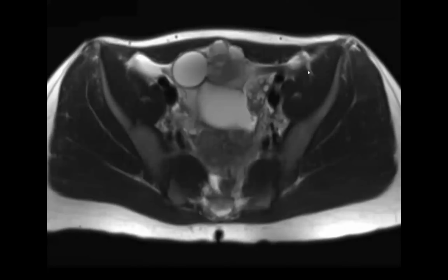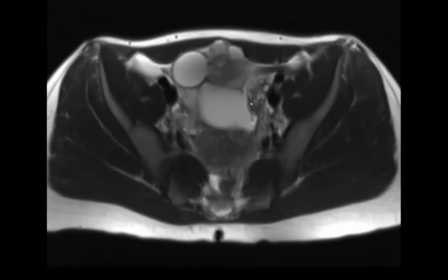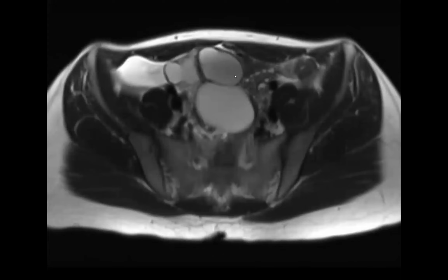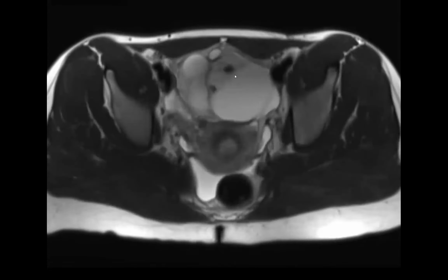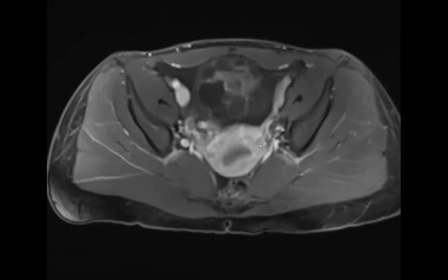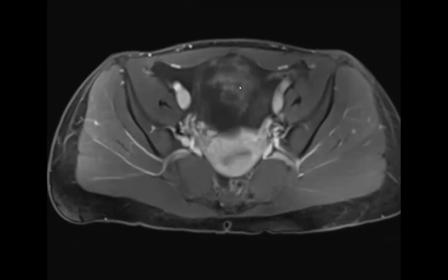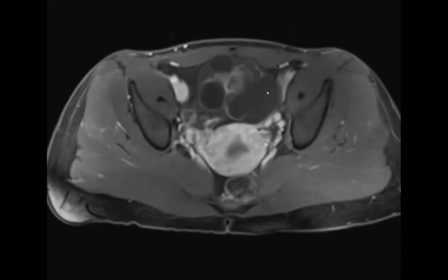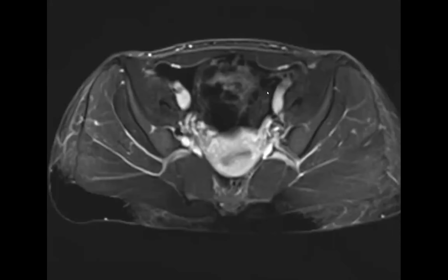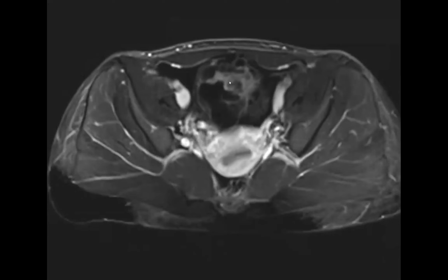So this is kind of a companion to what we were talking about earlier today. This was a multi-cystic adnexal mass. You can see that there are multiple cystic locules, a little bit more complex area centrally here. I'm going to show you the post-contrast. There are enhancing septations, but also maybe a little bit more solid enhancing component here. There was nothing that was T2 dark, so this is not a companion to the cystadenofibroma that we were talking about, but basically this is a multicystic mass with enhancing septations and maybe a solid part here.